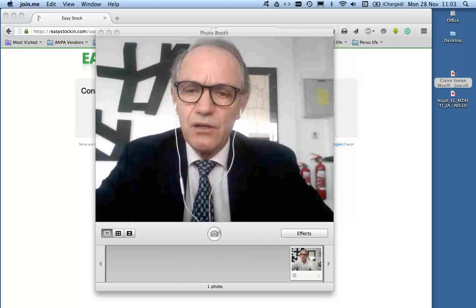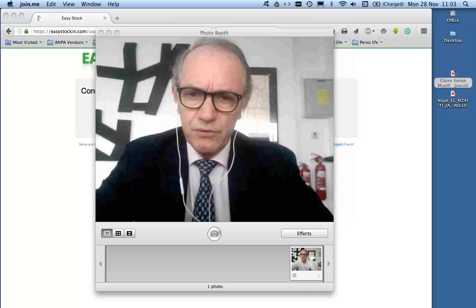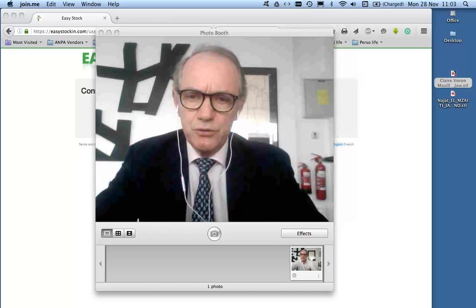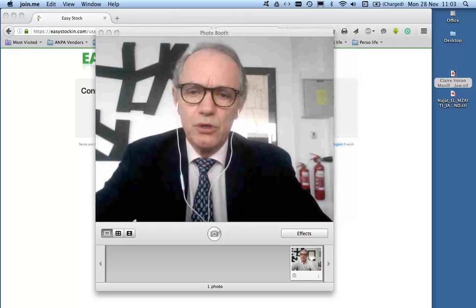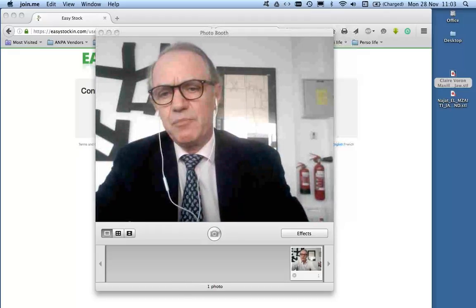Today, we are going to focus on EasyStock-in lab orders. This is a new feature which has been implemented in version 3. And for people who already use EasyStock-in, it will open a huge new area to work on in the lab orders.